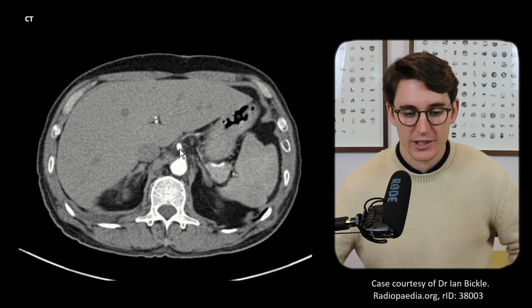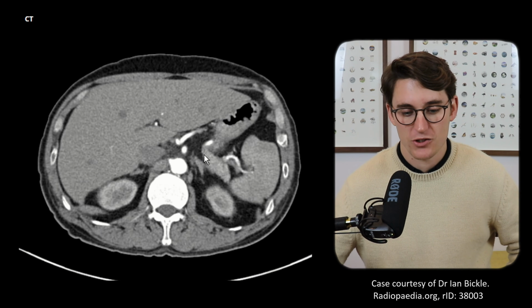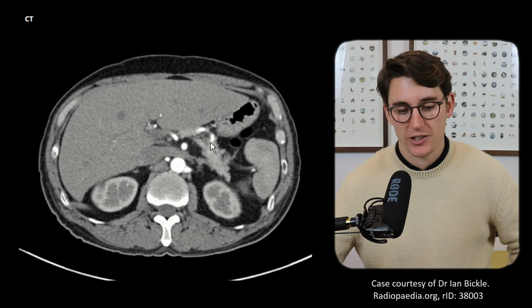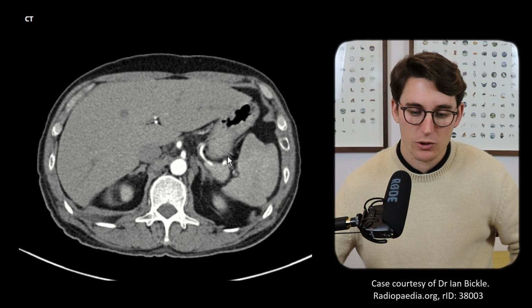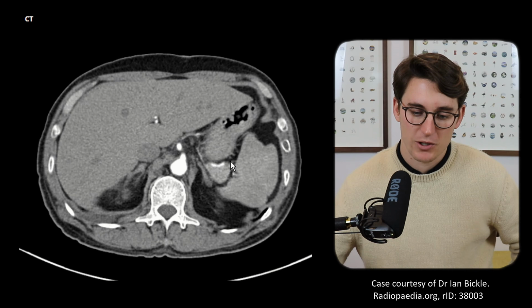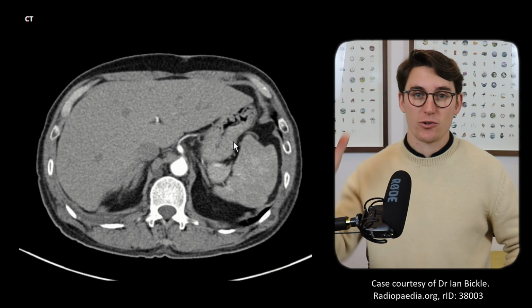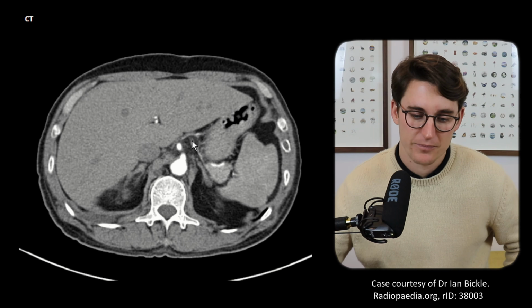We head further along, we can see it then gives off its second branch, or in the trifurcation, which is our splenic artery. You see how tortuous the splenic artery is all the way out to the spleen. Now that splenic artery we can see is above the pancreas here, so it's going to send pancreatic branches down to the pancreas. And you can see in what close proximity it is here to the stomach, so it's also going to send short gastric arteries coming off. And then we can see this long artery heading all the way around, which is our left gastroepiploic artery supplying the greater curvature of the stomach there. It's going to descend down in the left-hand side of this patient here.